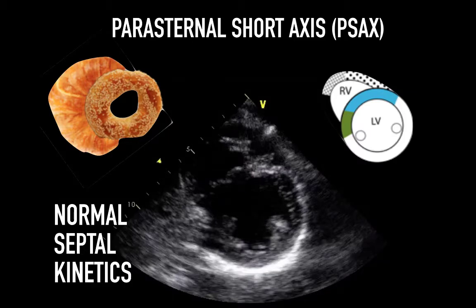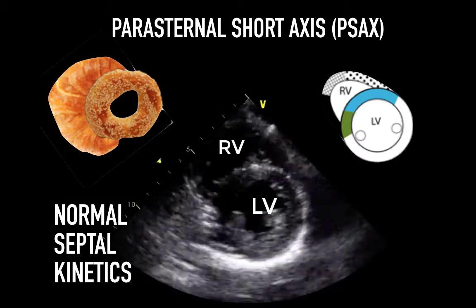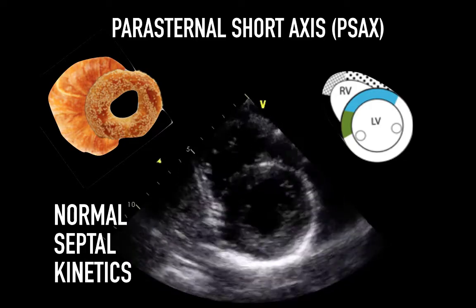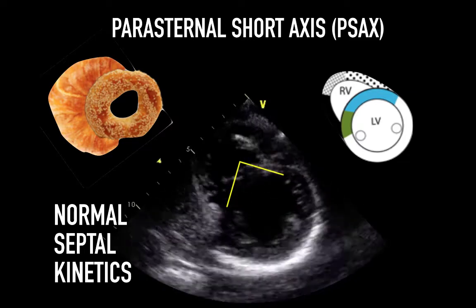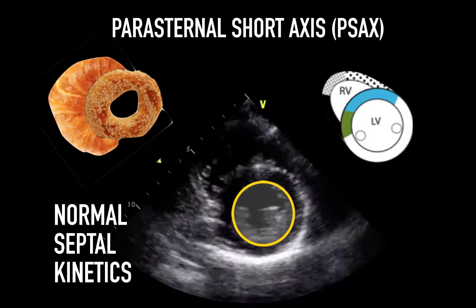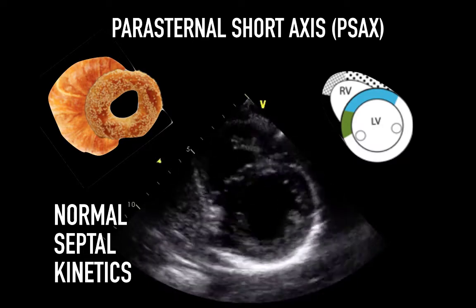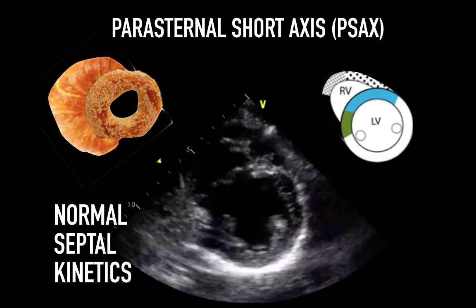On the parasternal short axis, we see the distinct croissant and bagel formation of the RV. This comparison is courtesy of our own Dr. Jean Deschamps. You'll notice that the LV wall, or septum specifically, is convex towards the RV. The inner cavity is circular in diastole and systole. The septal configuration can tell us a bit about the balance of pressure. Any increase in RV pressure over LV pressure, and we'll see the septum flatten, creating a D-shaped septum.